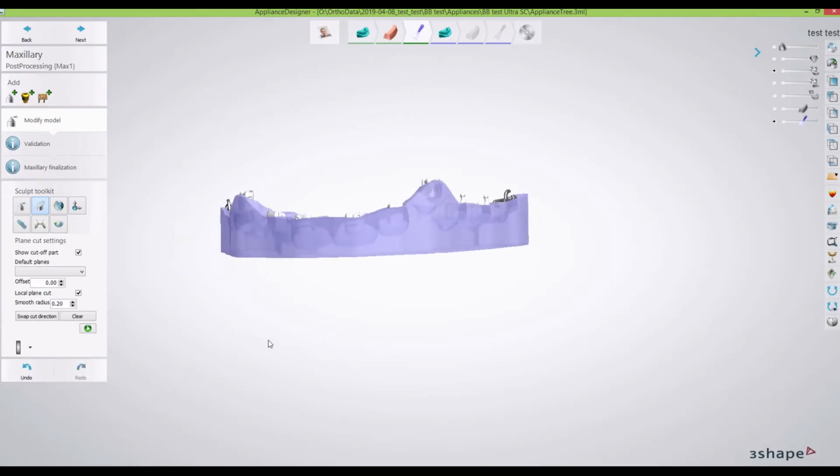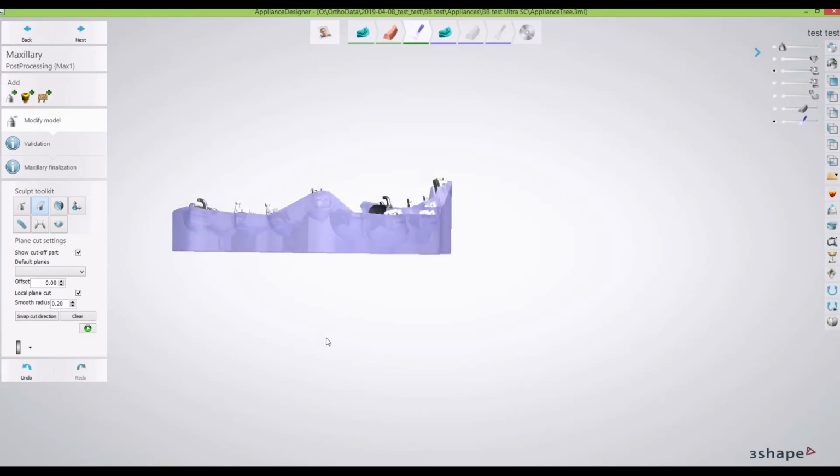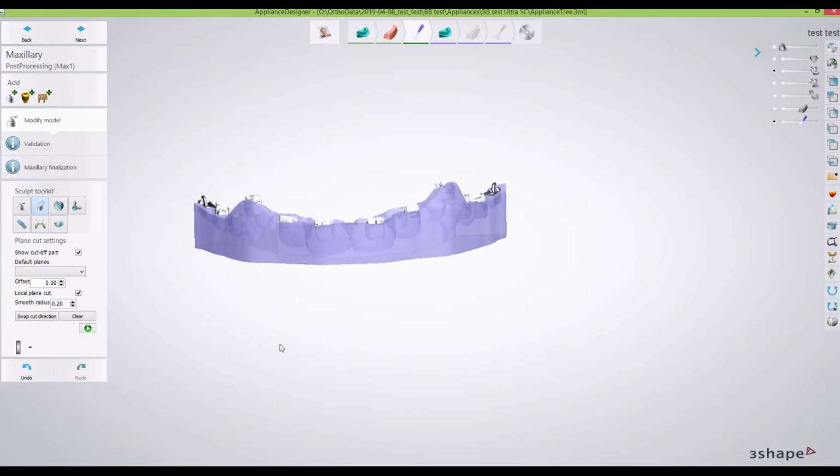We can see the upper portion of the bracket. For some reason, if I get to this point and I don't like something, like, oh, maybe I need more, maybe I need less, just hit the back button until you get where you're going. It will hold all of your changes. It's not like, oh my gosh, I'm going to lose everything that I've done. If you go backwards to adjust maybe an angle, or maybe you see that little spiky thing and you want to get rid of the overlaps, it'll hold everything when you start going next, so you're not really wasting your time.